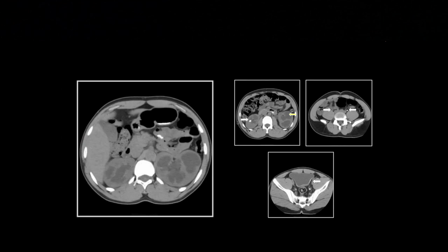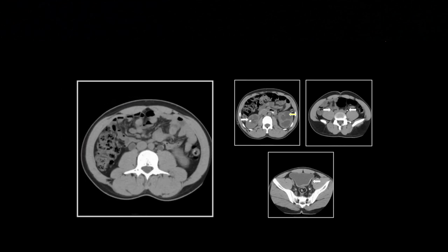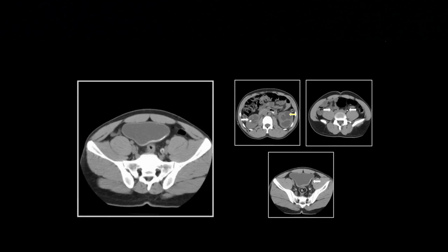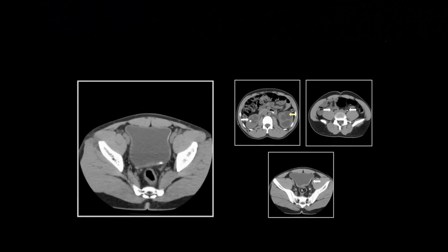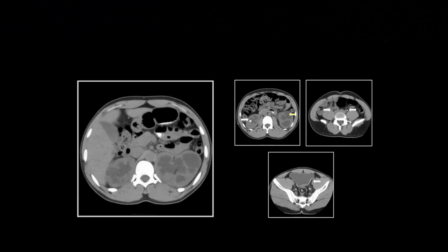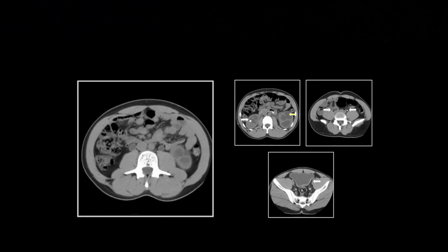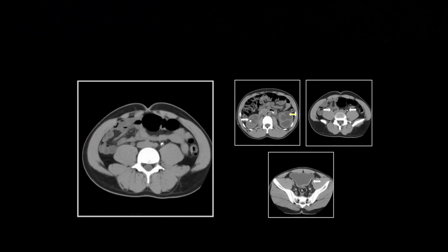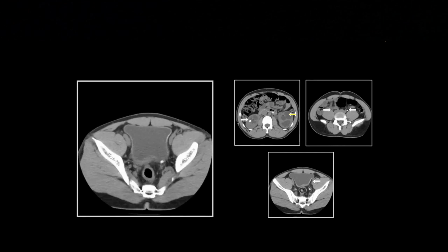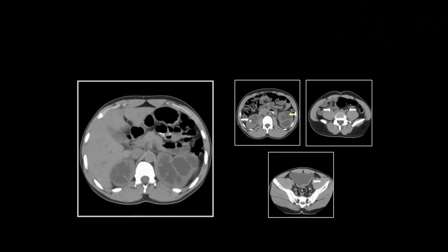Okay, so there is bilateral hydro, which is quite impressive. And there was a central stone on the right in the right kidney, but there wasn't in the left kidney. And again, that should make you really wonder, hey, could this really be XGP? Because without a central stone, you can't call that left one XGP. And honestly, the right one is just a nephrolith that isn't centrally located and doesn't appear to be obstructing. A very nice view of that bladder and ureteral calcification.